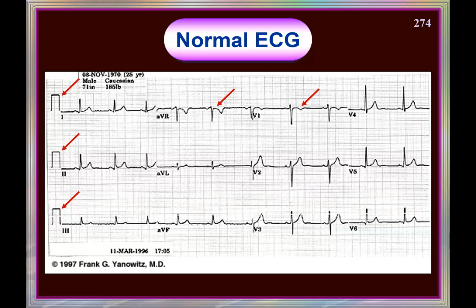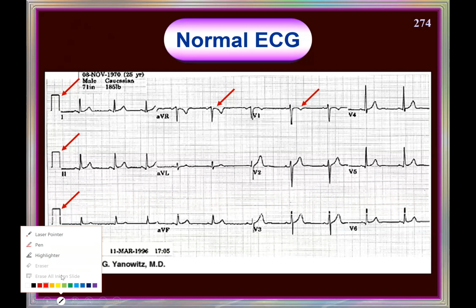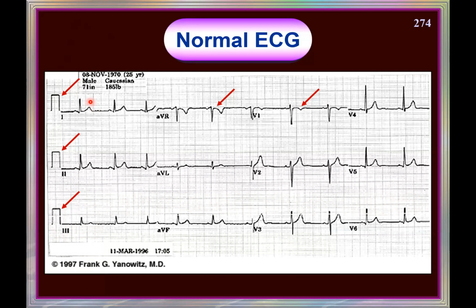Look at this ECG. Whenever you see an ECG, you concentrate on this part. What is that part? That is called the standardization. The standardization is usually 10 small squares equal to 1 millivolt. So we keep it that if this rectangle occupies 10 small squares or 2 big squares, that is equal to 1 millivolt.